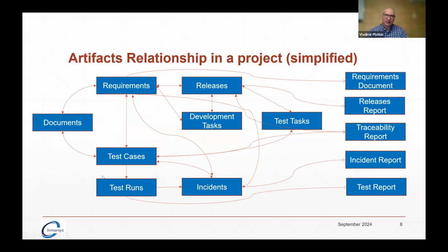So as an admin, I can delete it, but there's going to be a record that such a bad guy, Vlad, just went and deleted the test run, which is a big no-no. So it's a non-compliance. It's not really a good thing to have. But they're really immutable from the system perspective, so you cannot amend it. And it doesn't open people a possibility to massage the data, which is a really, really good thing.